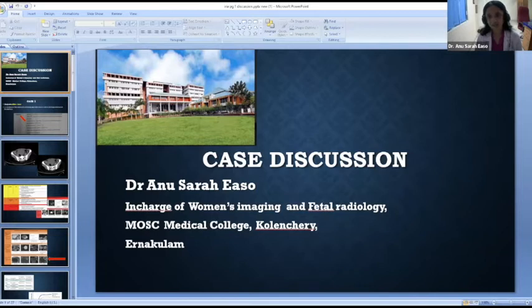These are the CT images. Actually, the patient initially came for CT. So we had acquired a few CT images, then we did the MRI. Just to show you, this is the fat containing part of the lesion where the attenuation is -143.